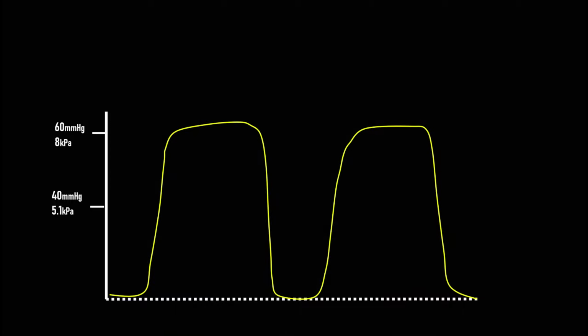Sometimes, maybe frequently in the operating room, you see this picture where the CO2 trace at steady state is very high. It's not getting bigger, thankfully, but it's not dropping. In the absence of the patient absorbing carbon dioxide, for example, during a long laparoscopic procedure, this is always caused by reduced alveolar ventilation, either due to inadequate tidal volumes or inadequate respiratory rate. It can also be due to excessive dead space due to too much PEEP, or an inadequate expiratory time due to a long inspiratory time with respect to the E time, or all of the above. Whatever way you look at it, this is hypoventilation.